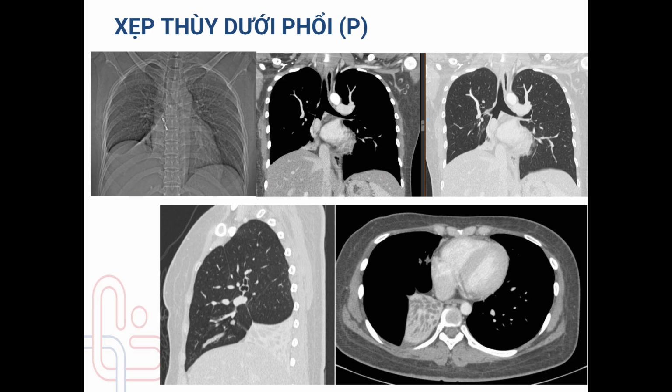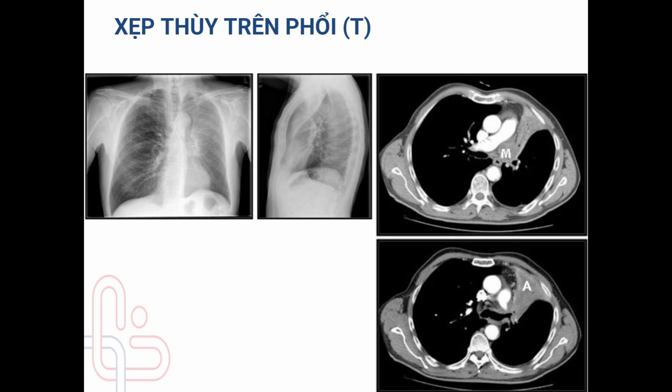inflammatory, and fibrotic patterns. Understanding these characteristic segmental appearances across axial slices allows radiologists and clinicians to navigate the lungs with precision, improving accuracy in diagnosing segment-specific pathology and guiding targeted interventions such as bronchoscopy and segmentectomy.